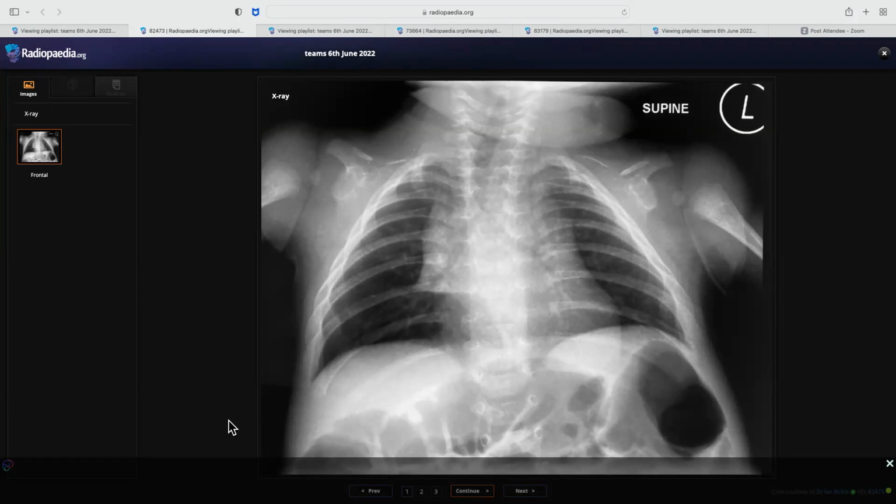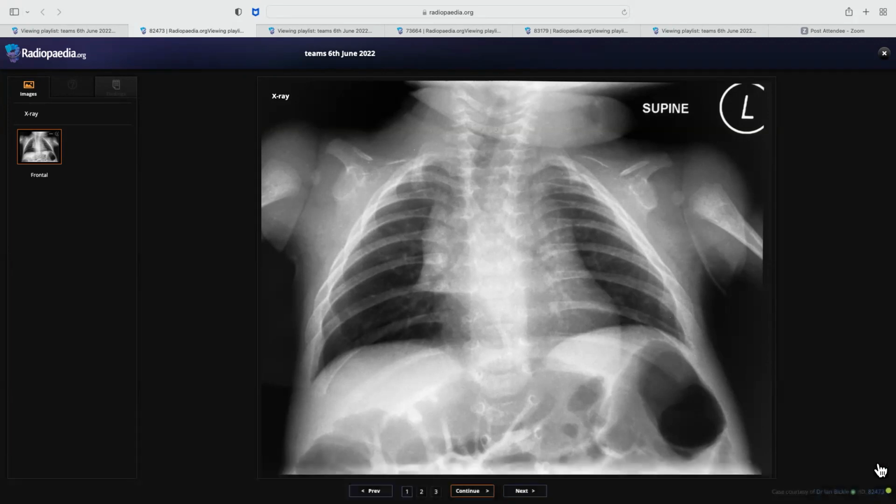The patient is coming from ICU or patient is coming from OPD? No, OPD patient actually. So I'm suspecting that there are some rib fractures here on the left side. The second rib, and then again, if I come down, this area, I think there are some rib fractures, or the posterior ribs are fractured. I am concerned in this age group, and also suspicious of a scapular fracture.